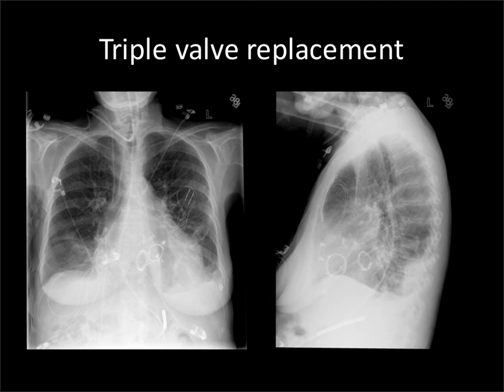Okay. So here's a patient who's had 3 valves replaced. Let's see if we can work them out. I'm just going to give you a couple of seconds to see if you can think about it from the prior diagram. Okay. Aortic, mitral, tricuspid, mitral, tricuspid, aortic.